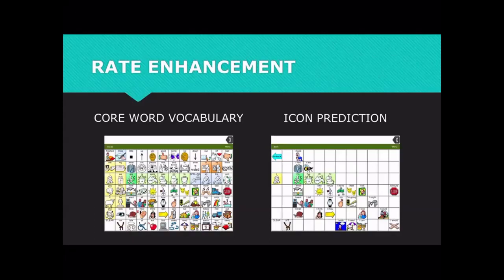And then you can get into the transition, where you're transitioning from 82 core words to, excuse me, the 84 transition, which has 205 words. When you click certain buttons on the home screen, you'll see a new page appear, and you see the remaining words to continue the sentence, or to really get into what the individual wants to communicate.